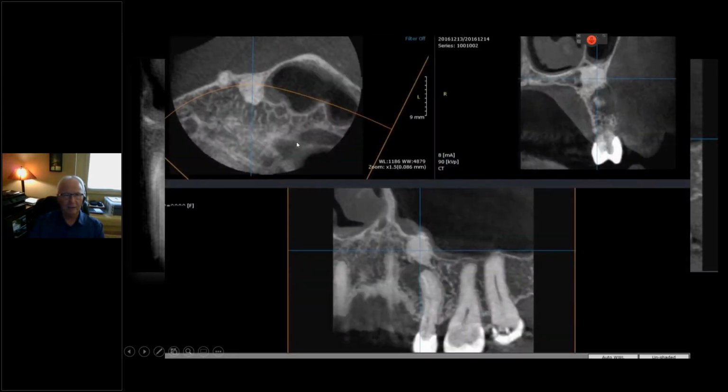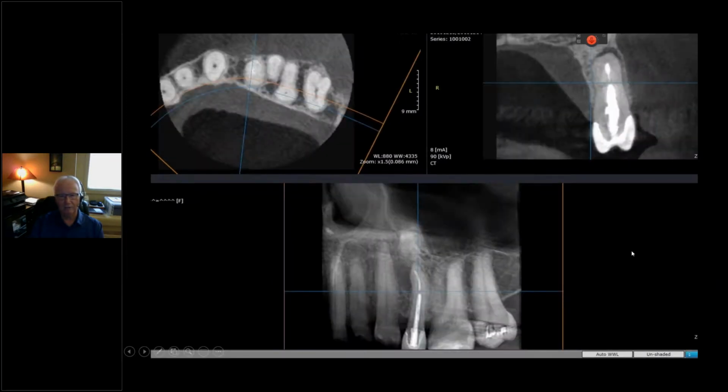And when we looked at it in several different planes of section, we were looking to see if this was osteosclerosis or dense bone island. This was the view that I saw, and I went, oh, that's fractured. That's why this is radiolucent. It's not a failed root canal. It's a fracture of the tooth and, you know, problems post-operatively.